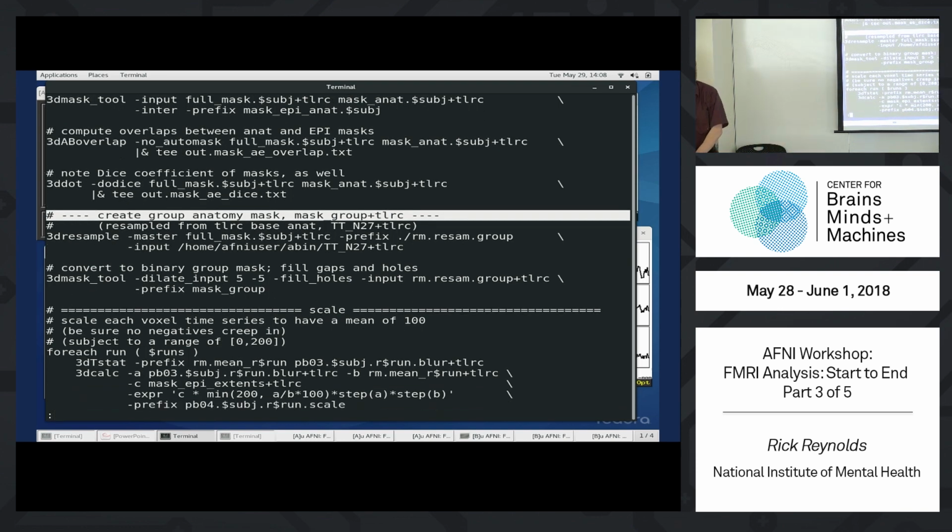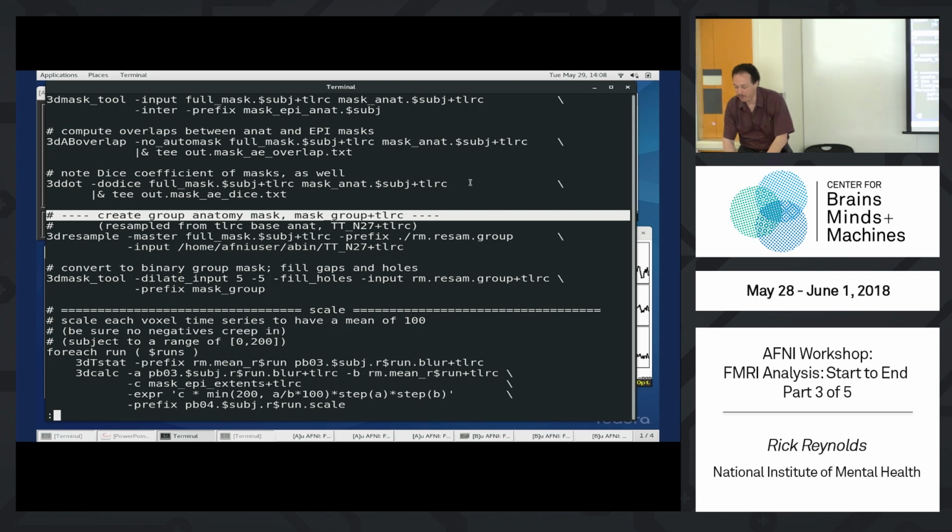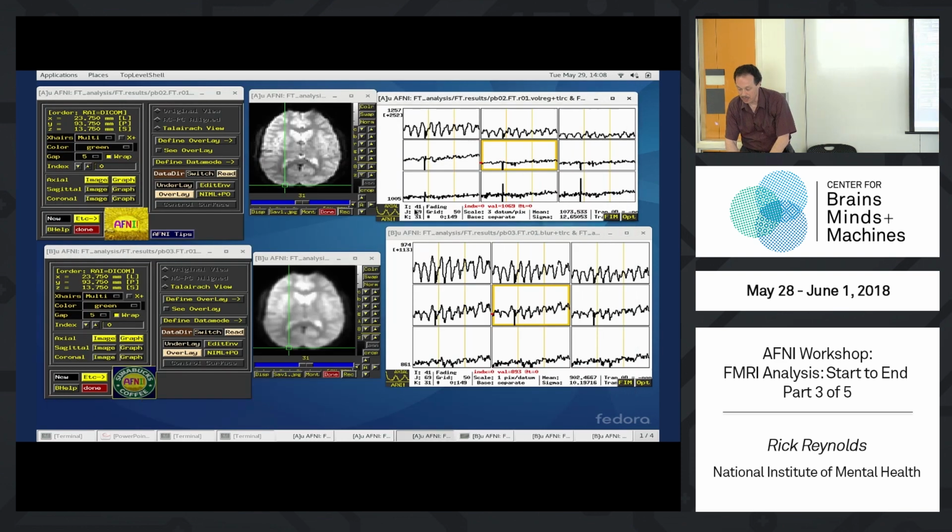So those are the masks that are created, and now let's just take a brief peek and see what they look like using the GUI. How about I'll do this so you don't mess up your locations and stuff like that. I'm going to save this coordinate by jumping to XYZ. I'm going to throw away the old coordinates and just save this in my GUI, and then we can get to it later. I'll jump to 24, 94, 14.